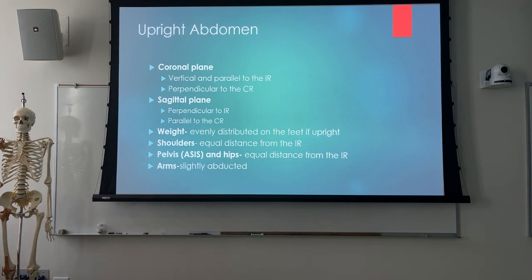So upright abdomen. Basic positioning is really the same, with the exception of potentially putting the top of the image receptor in the armpit. It doesn't really matter anymore because the doctor's not there anymore, but some doctors like to see the symphysis pubis and the entire bladder area on the upright abdomen.